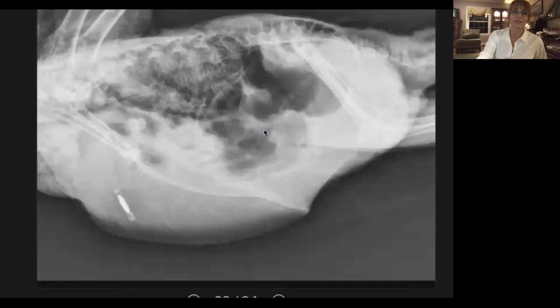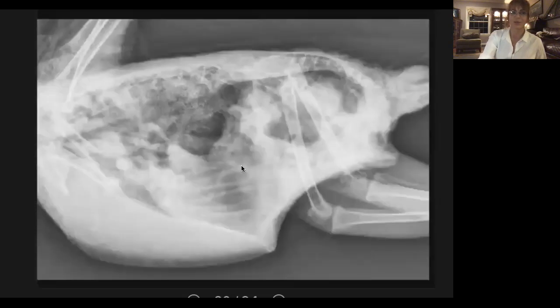And then as disease progresses, and this is always going to be aspergillus, there's nothing else that can completely coat the air sacs like this other than aspergillus. You can't find the GI tract at all because we no longer have air in the air sacs giving us our contrast. And you can kind of see where all those air sac lines are. Here we're getting even worse. This was the same bird actually, where just the air sacs are completely filled up.